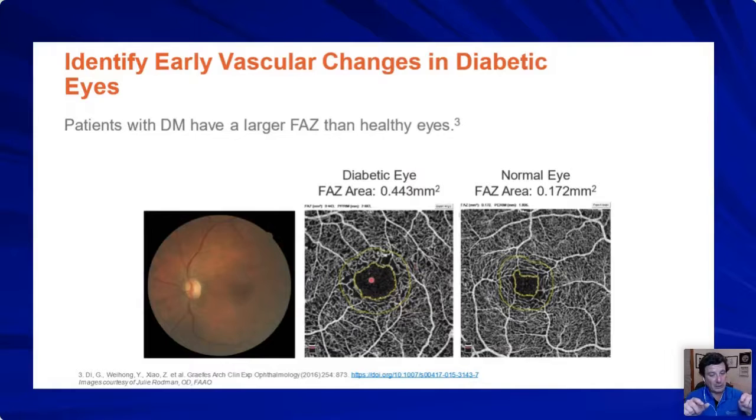The foveal avascular zone, right? So just outside the foveal avascular zone, theoretically should be the thinnest amount of capillaries. And that's what diabetes is, right? It's a capillary disease. It picks on the capillaries first. That's why we have neuropathy, fingers and toes, nephropathy in our kidneys, retinopathy in our eyes, and we can visualize this retinopathy at the foveal avascular zone. Look at the dropout, and then look right here. Everyone look right here where I'm circling. I'm going to put my pointer right on top of it, and then move my pointer away. That's a microaneurysm.